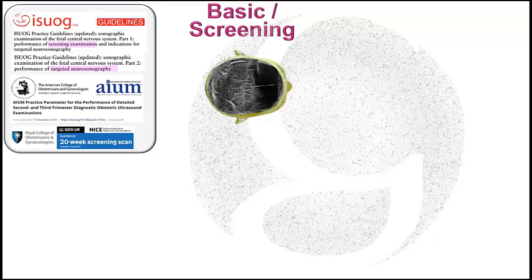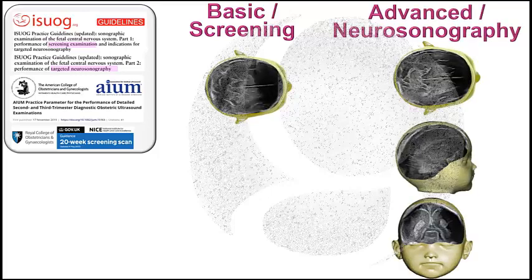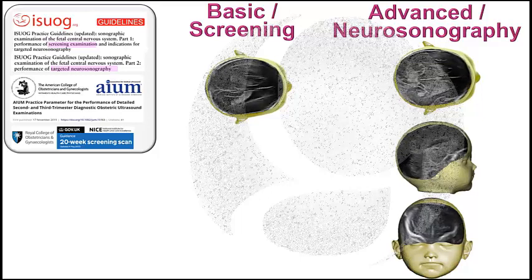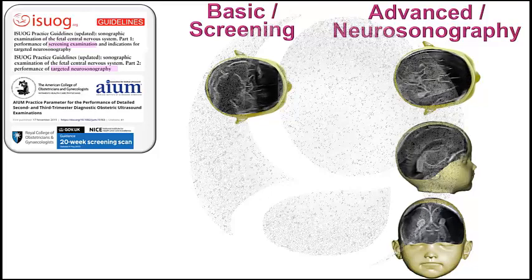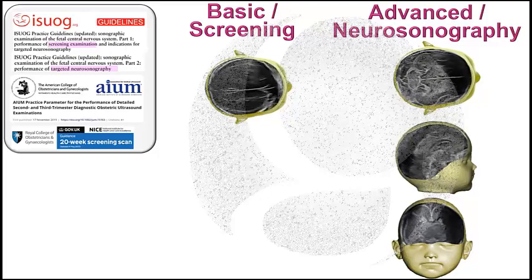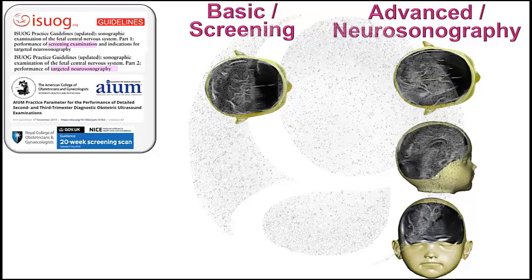If in this basic or routine exam we find any abnormality, then an expert and advanced exam or neurosonography should be carried out, with the contribution of the sagittal and coronal planes in order to do a comprehensive multiplanar evaluation of the fetal CNS. And this is the protocol actually followed in many countries.